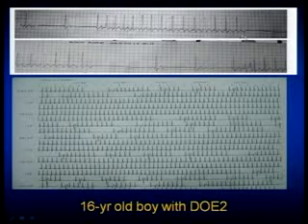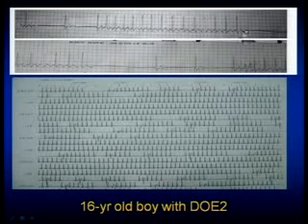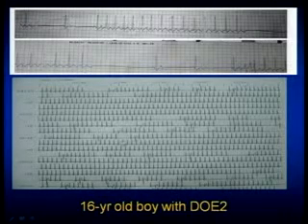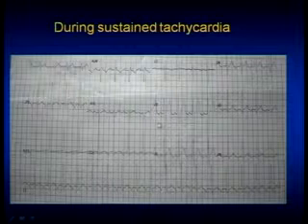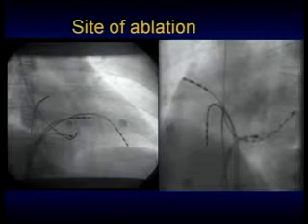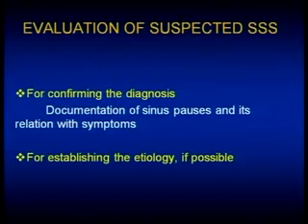Two unrelated events happening simultaneously. So it is not an atrial tachycardia. So there are some reentrant beats as well. So, significant pauses. This was taken during a sustained phase of tachycardia. This turned out to be a PJRT, or permanent form of junctional reciprocating tachycardia.